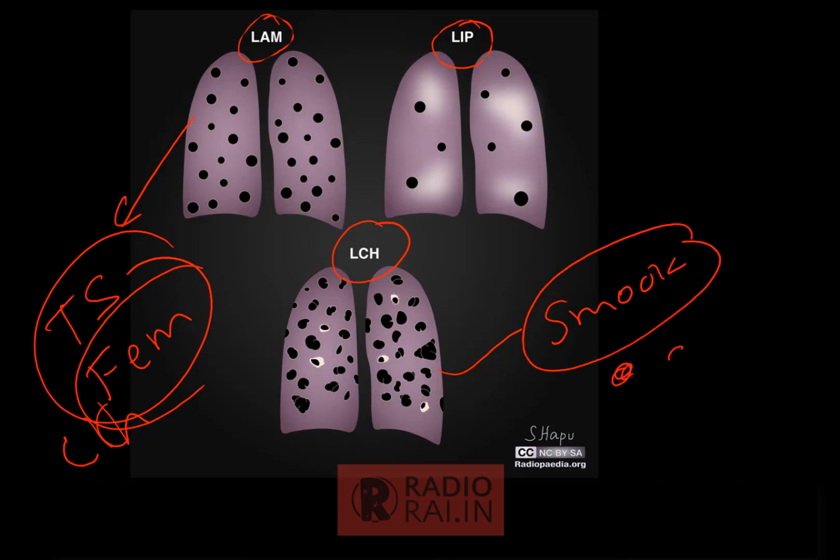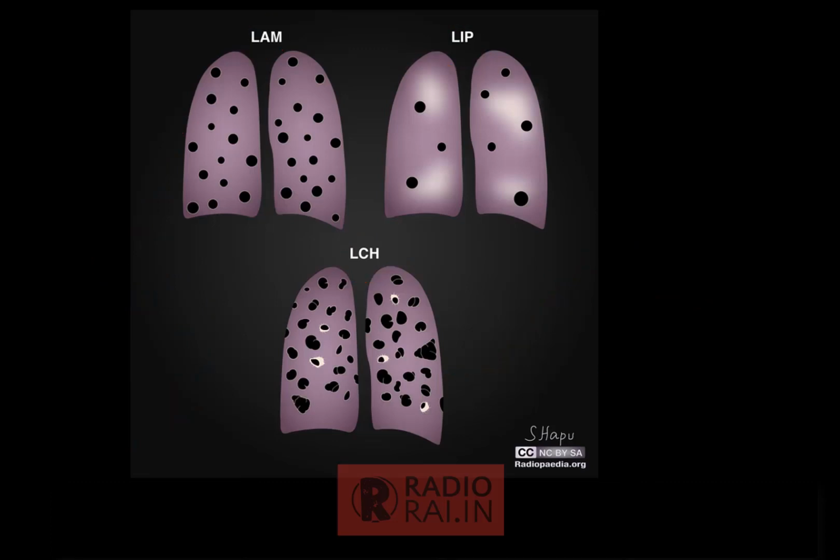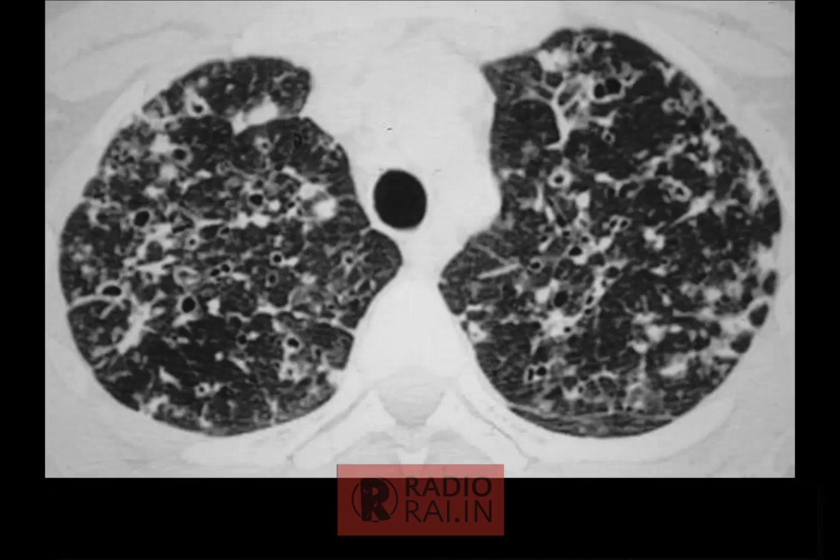In Langerhans cell histiocytosis, usually seen in smokers, there will be nodules, and again this is a smoker. There will be upper zone predominant involvement, and these nodules will undergo cavitation, and that's how these nodules will sometimes have thick margins and irregular cysts. Upper lobe predominance is how Langerhans cell histiocytosis presents, whereas LIP has perivascular cysts with diffuse involvement and a countable number of cysts.